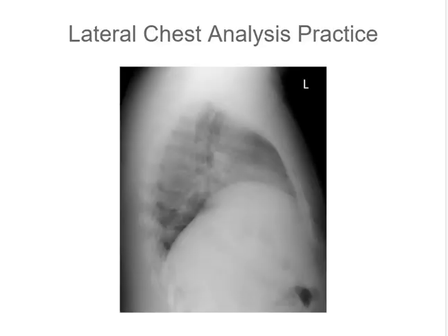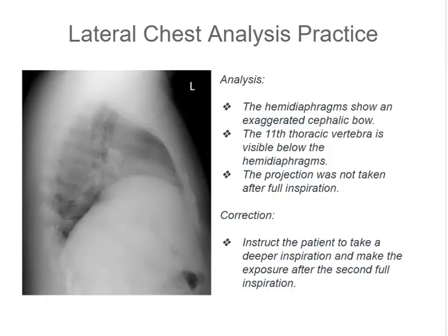Take your time to analyze this image and we will review it. First, we want to look for any rotation here in this image. And the posterior ribs seem to be superimposed, okay?